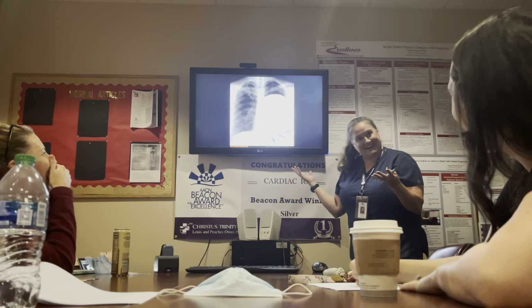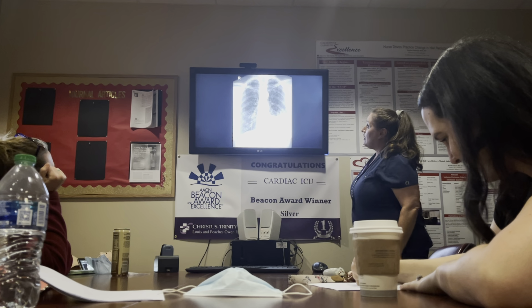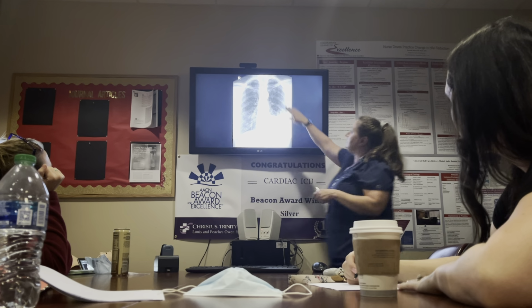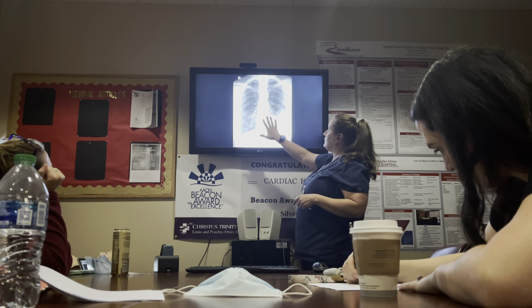What extra is hiding in the chest x-ray? Okay, you gotta have some humor. Okay, all right, so looking at this chest film, it's a relatively good quality because you see the entire apex of the lung to the base. You see side to side, so there's nothing cut out of there.